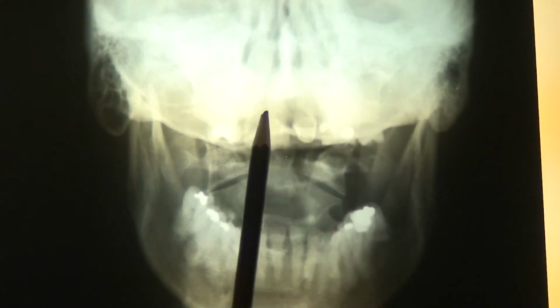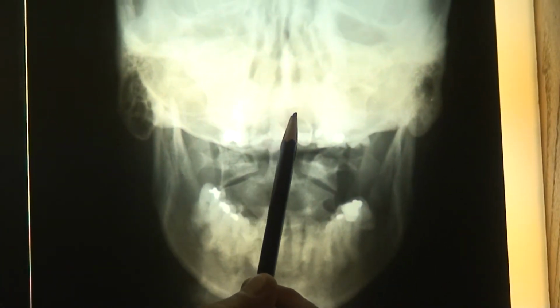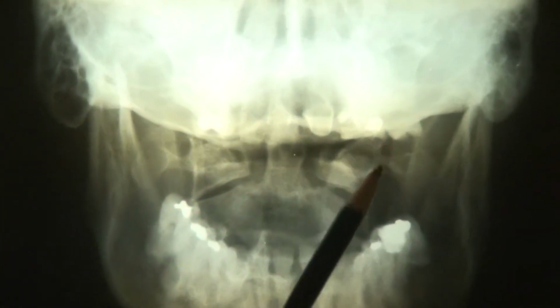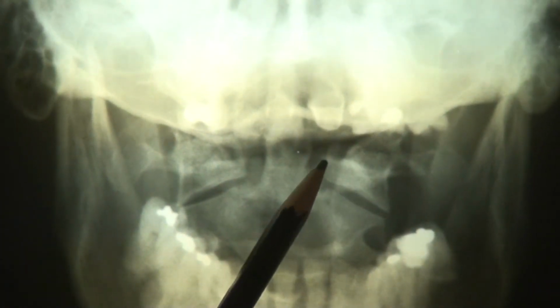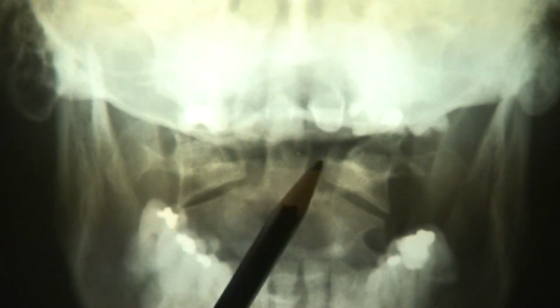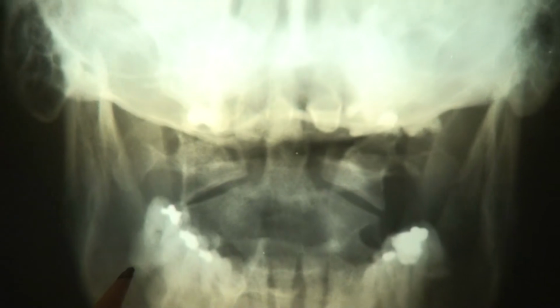Now when you look at this, you can clearly see the foramen magnum. We can outline it right here. It's in good position. If you drew that in the arcs, or if you follow the 5-step method we teach in the next webinar, you will see quite easily that this is a left laterality. Now let's go to the other film.